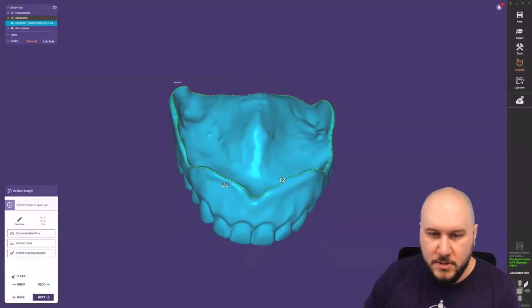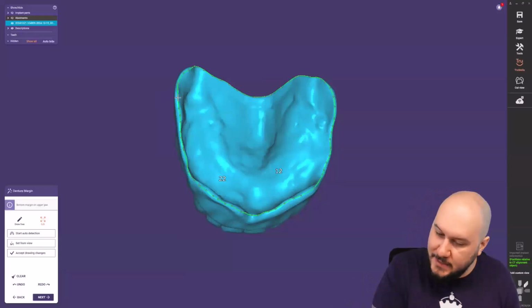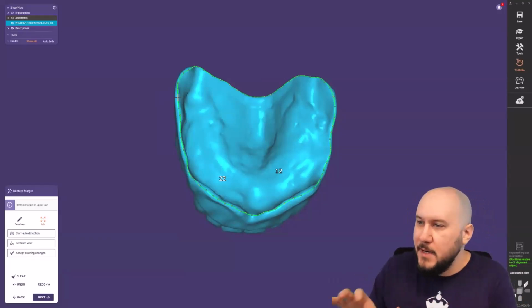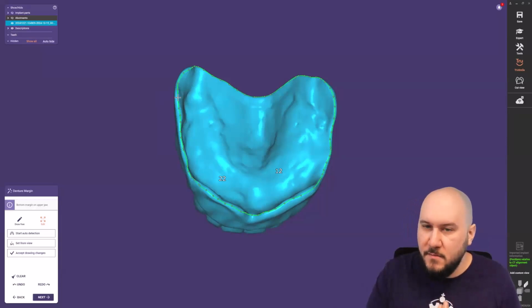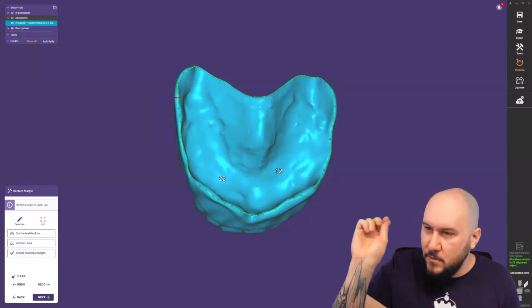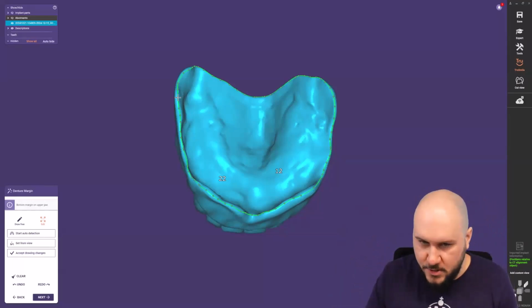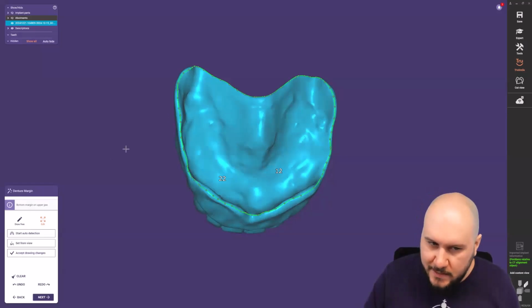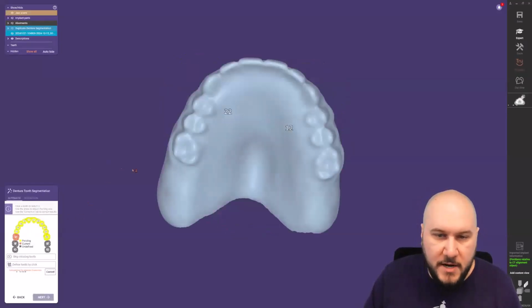So now you see the workflow contains the exact same workflow type that we had made with our duplicate denture before. But the small thing is that we just changed the denture scan at the beginning by clicking on expert, on tools, add remove mesh, and replace the denture scan. And now the workflow is exactly the same like this. The model is made out of the generation.